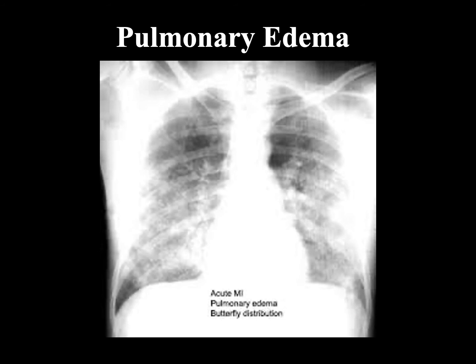Pulmonary edema, so you see a lot of little, almost pellet looking areas here, a lot of infiltration with pulmonary edema filling in all these areas of the lung. I call this a butterfly distribution. You see the wings here and the butterfly. That's more of a pulmonary edema.